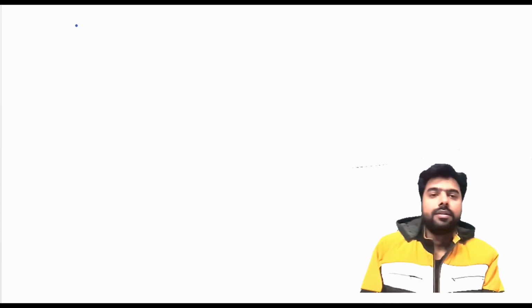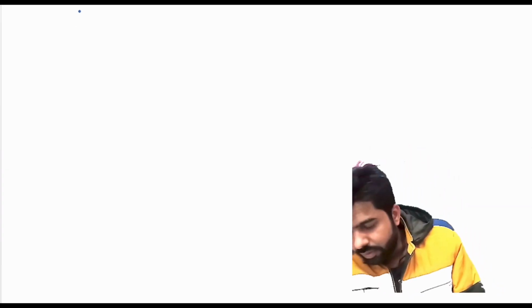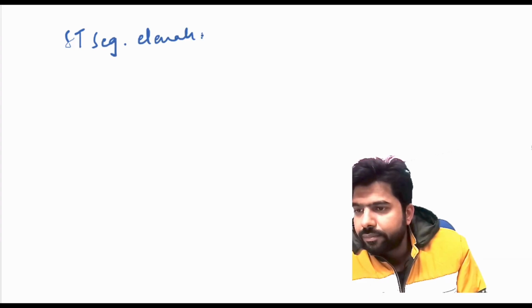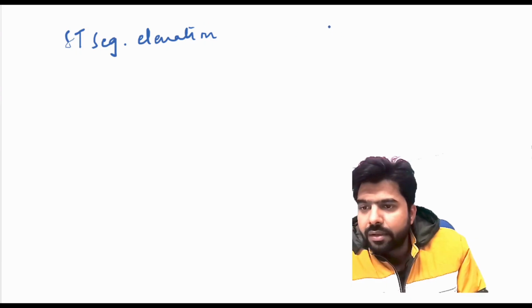Now, ST segment elevation and ST segment depression.